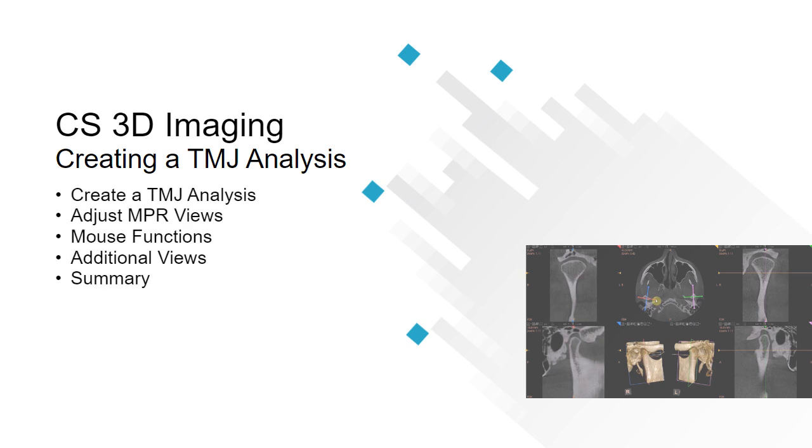CS3D Imaging, creating a TMJ analysis recorded class. This recorded class is designed for clinical team members. It provides the workflow for creating a TMJ analysis using the bilateral tab.